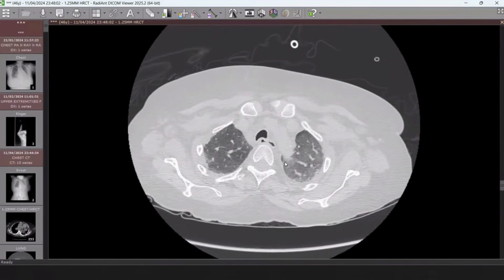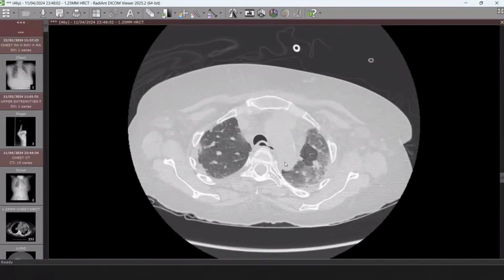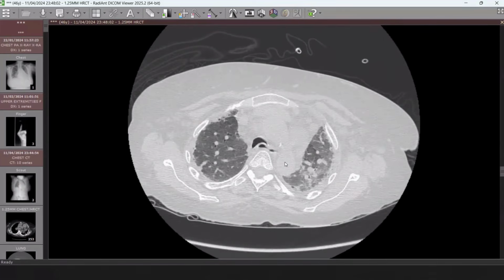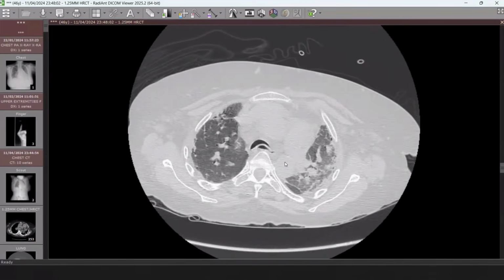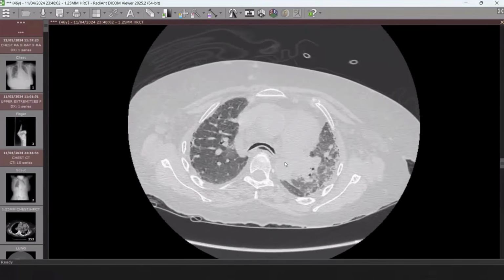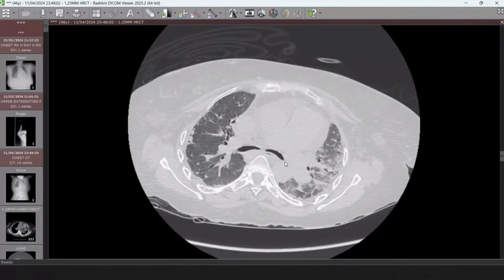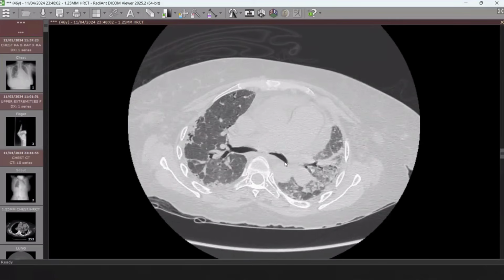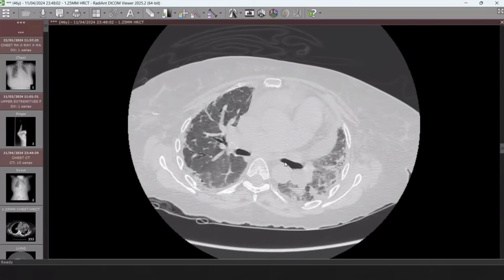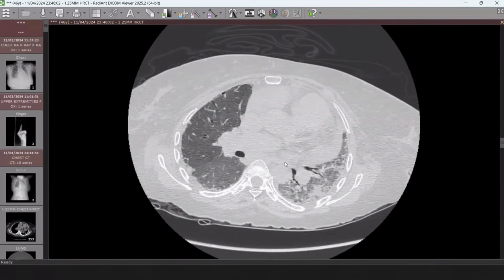So there is also ground glass haze seen, which is involving the whole of the left lung, with peripheral reticulations also seen. And I'm looking at there are areas of subpleural fibrosis seen, which is involving bilateral lung fields, which is more marked on the left side.